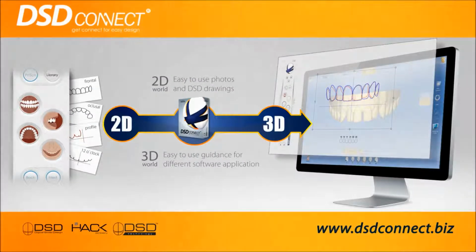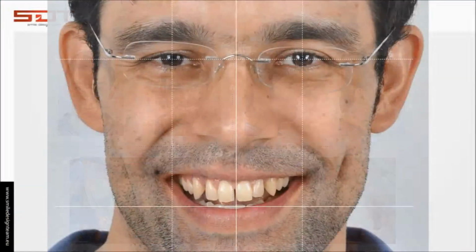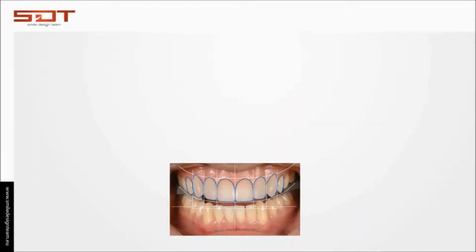The goal of the DSD Connect is to guide your design so that it is easier, faster, and more accurate. The execution of the DSD design is specific to the DSD Connect application. Apart from the final contours, it is required to do the design of the initial contours needed for the calibration with the teeth from the 3D model.